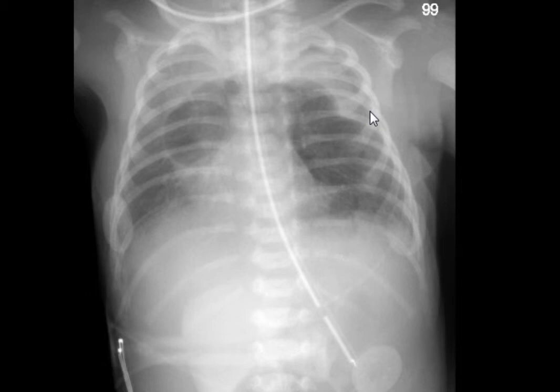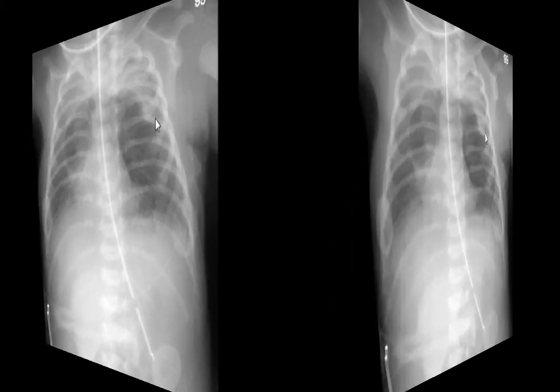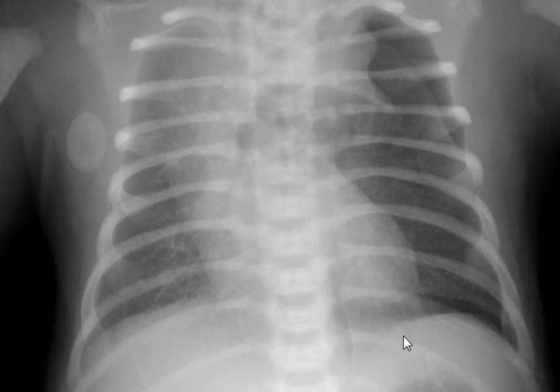Again, generally, hemodynamically, pneumomediastinum should not really interfere with function or lead to serious problems in the respiratory status of the neonate. There rarely will be such a thing as a tension pneumomediastinum. Generally, they're self-limited and will disappear on their own. This is a patient that happened to have a left pneumothorax.